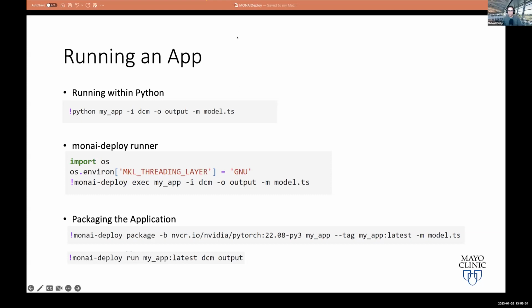Anything else? One more actually just came in. It says, is it possible to run the MAP with an input trigger, meaning the model predicts segmentations only when new studies are added to the PACS? Currently, it seems to work only on fixed input and output directories. So it's possible, and I will again show the demo.